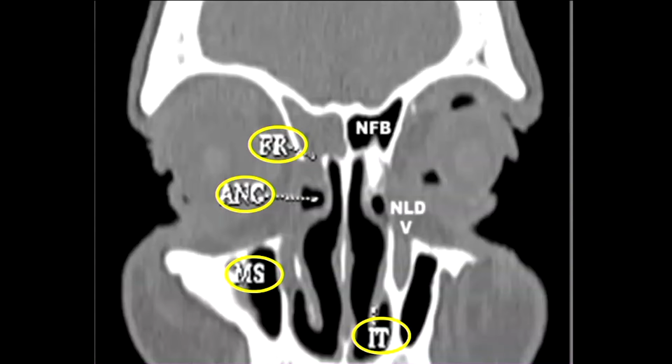So on the right, you can see that there's bone continuity in the floor of the frontal sinuses, going from the midline out to the orbit. So that's the eye there. Whereas on this side, you've got that loss of continuity of the bone. So that's how you identify where the frontal sinus drains into the nasal cavity, and we call that the frontal recess, and going downwards, that's the frontal sinus drainage pathway.